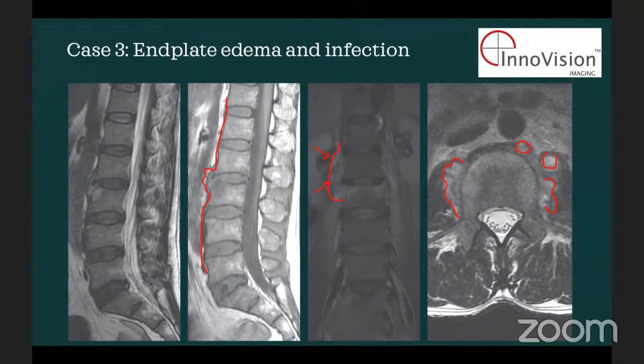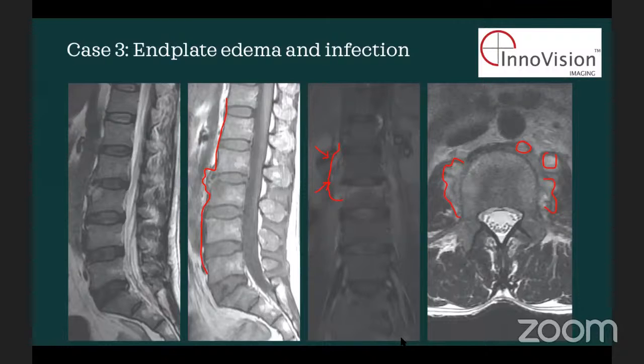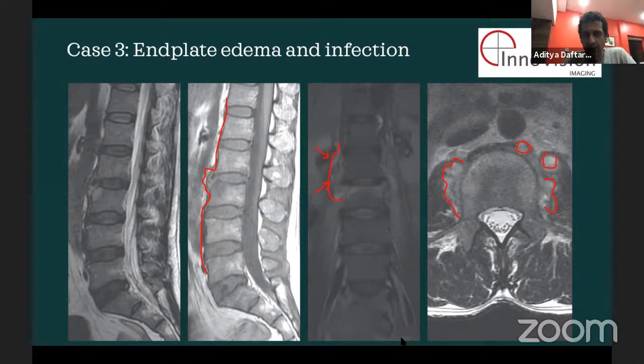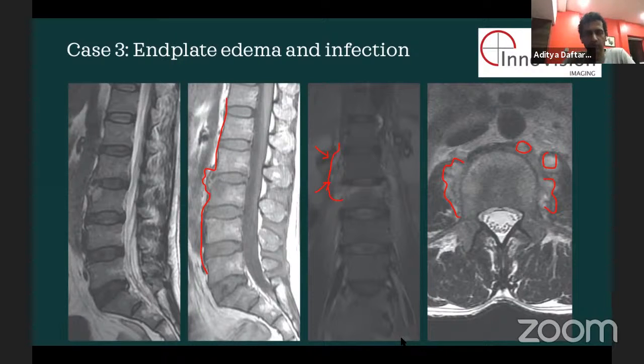Any questions from anybody about this case? Then we'll just go on and start looking at, or anything that the other faculty has to add about this case? And then we can just go on and show some more examples of these different things. Sir, in case of a shiny corner sign? I'll show you examples of all of that now. Just to differentiate, yes. I'll show you examples of all of those in a minute. But anything the other speakers would like to add on this case?